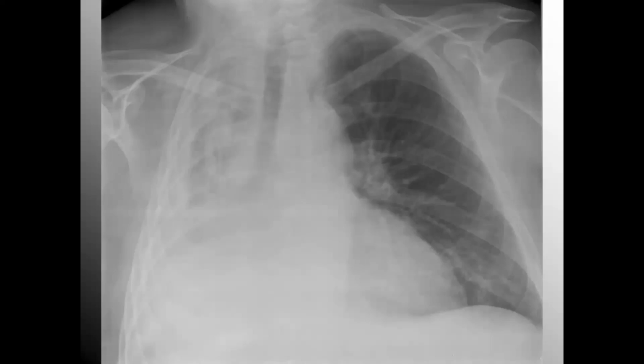And it's offset towards which direction? The patient's right. So my airway is patent. I do not have an artificial airway. We'll look at some examples of an artificial airway coming up. So the patient is spontaneously breathing. They could be on non-invasive. I can't see their face, but they're not intubated. They don't have a tracheostomy tube at least. Could they have a stoma? It's possible, but it's not midline.